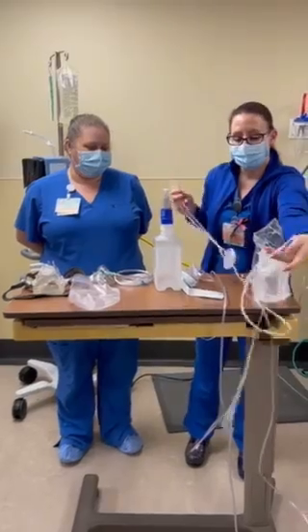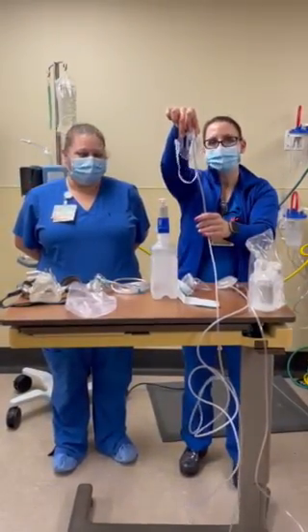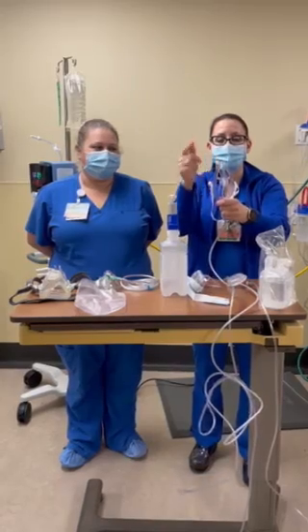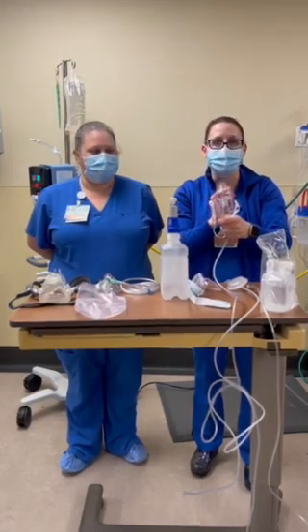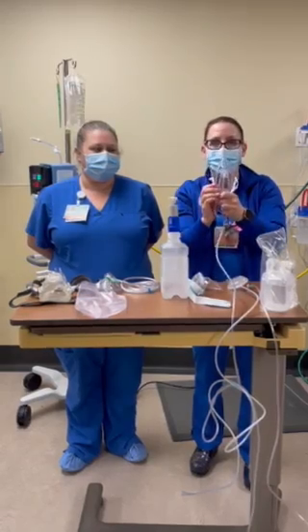If you have to go higher than 10 liters per minute, Oxymask. Next step, right here, you can flush this out at 15 liters per minute. It's really nice. What's great about this is you can wean it down. So if they are more comfortable, or they're a mouth breather at night when they fall asleep and you need 2 liters versus 15, you can do that with this mask.